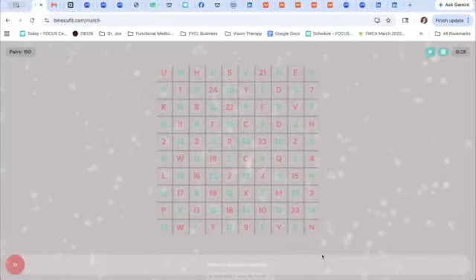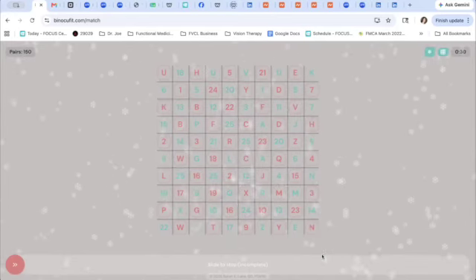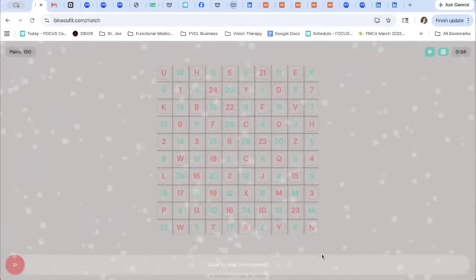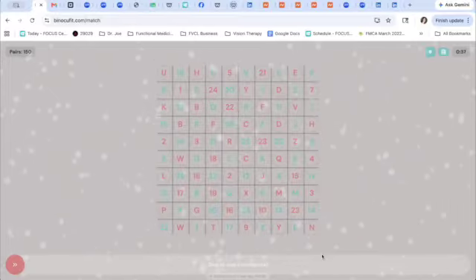I've also used this 10 by 10 just as like a saccadic grid, just like you would use a Hart chart in the office. You could put flippers over it, that type of thing.